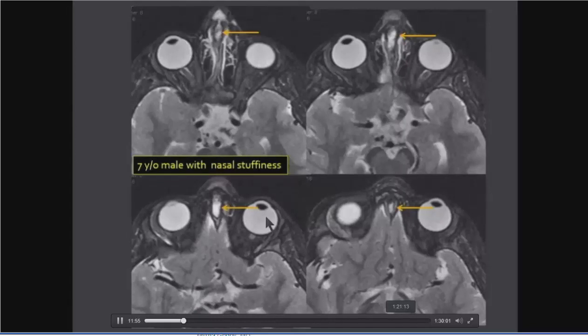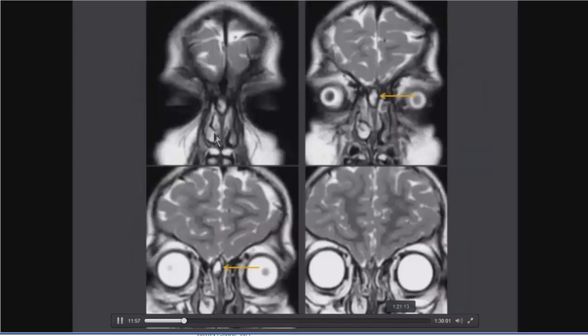So we should look at it on one more plane. This is a coronal image. Again, this is the lesion. It's easy to miss if you don't know what you're looking for. Thankfully, the surgeons tell us exactly where the location is clinically. And this reaches up to the intracranial compartment, and we do not see any clear-cut intracranial extension. So it seems to stop at the expected location of the foramen cecum. And that's a clue, because lesions associated with the foramen cecum are usually congenital developmental abnormalities.